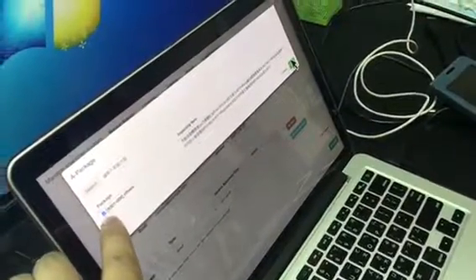All right, so here you see this number, the serial number of this tube, and this is the type. So we need to choose blood type, and this is the date when we received this, and how many tubes, the number, and we need to give it what kind of test. So let's just choose this one, some test, and okay, add.